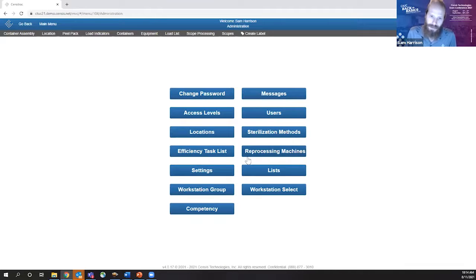But prior to that, I want to show you how to do it screen by screen and talk through some of the detail. What I'm doing here might seem very drawn out and long, but that's just because I'm talking a lot and giving a lot of detail. Typically, once you get these processes down, it's pretty quick.